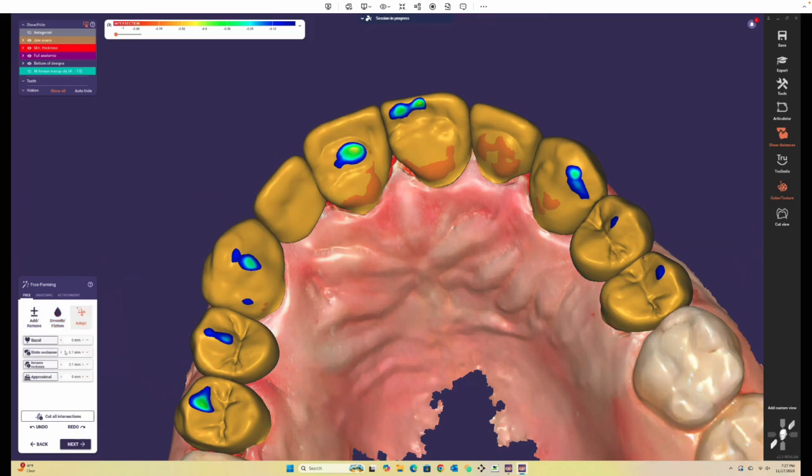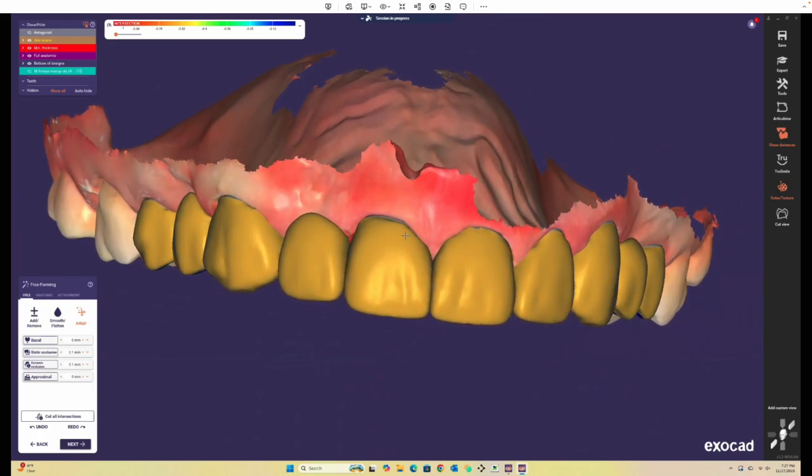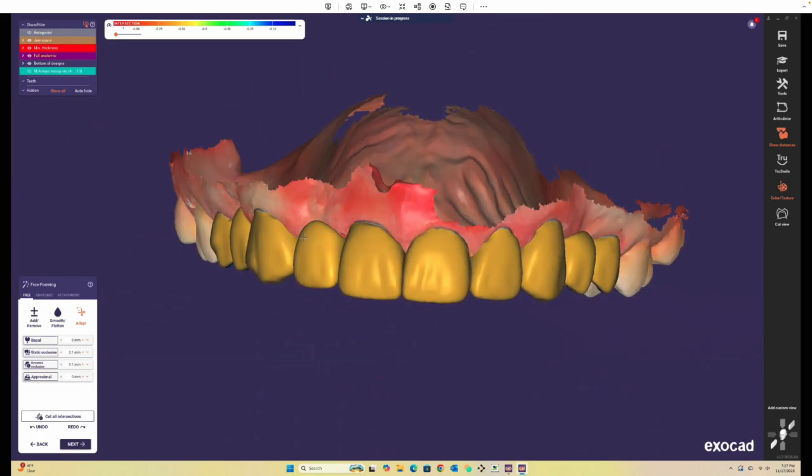Let's just click adapt all, and I'm going to adapt everything but the dynamic. I can adjust that by hand. And then you continue, you got pretty good preps. And that's how you do it.